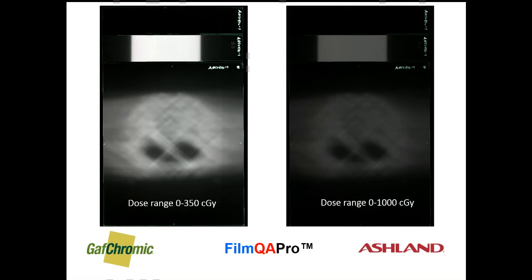To illustrate the difference, this slide shows dose maps with ranges of 0 to 350 and 0 to 1000 centigray. Not only does the higher dose range diminish the brightness and contrast of the display, but it also reduces the precision and dose resolution. But remember, too low a dose range is also not good, since it truncates any calculated doses higher than the chosen maximum. That is, these higher values are reset to the maximum value of the dose range.